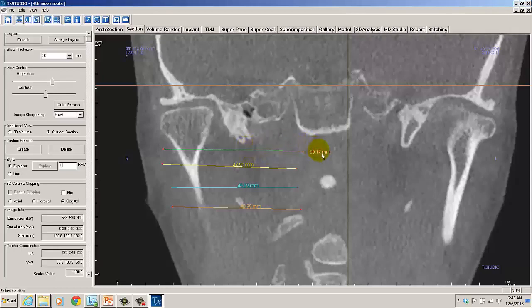So in this instance, we can be certain that our corresponding measurement to our line is where it needs to be. And then again, just move those measurements to wherever we would like, and then left mouse click on the surface to lock it in. And again, to delete, just left mouse click, the active state it will turn red in the active state, and then you can go ahead and delete it at that time.